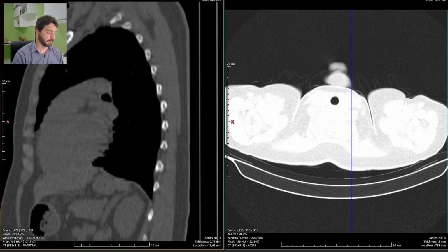Yep. I have to tell in this kind of exam that there is no signs of acute pulmonary disease, just to be sure that I have actually looked at the lungs and I can tell with confidence that there is no lung disease that justifies the complaints of shortness of breath.